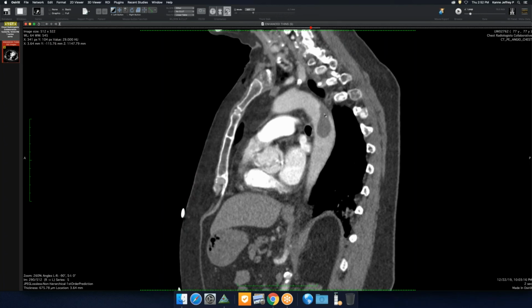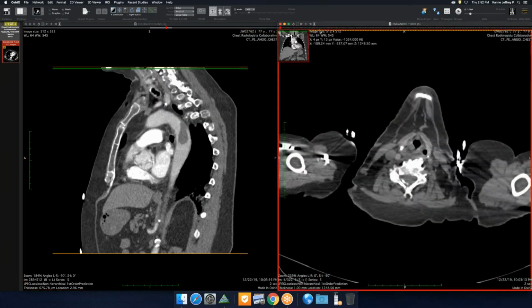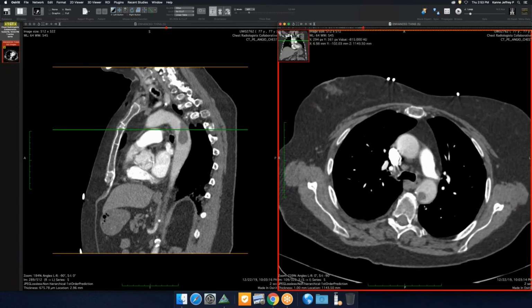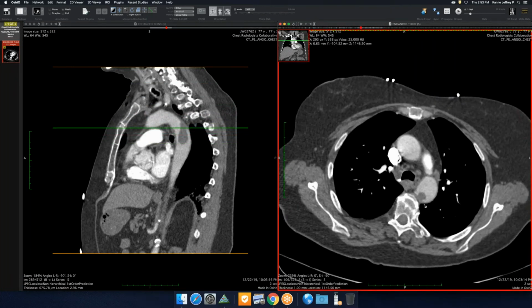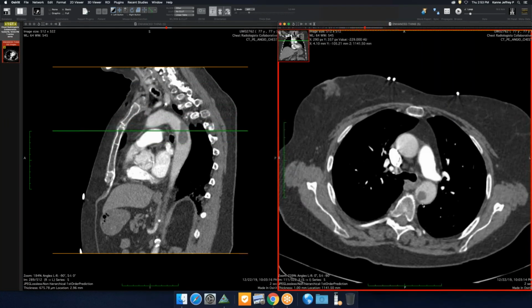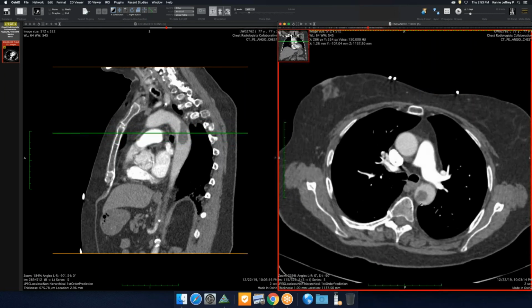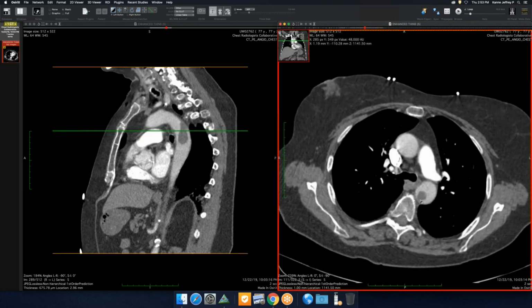Yeah, it's interesting that it's just along the greater curvature of the aorta rather than the lesser curve where we typically see these. Now, in the original echo review where they had a lot of these thoracic aortic thrombi, some of them did occur, a minority along the greater curve. Yeah. And the fact that you have a prior from 6 months ago is reassuring that it's not an intimal sarcoma. Exactly. And she does have a remote history of lymphoma. It sounds like it's in remission. It could always be in the differential, but it is so bland and homogeneous and low attenuation. It would be really unusual.